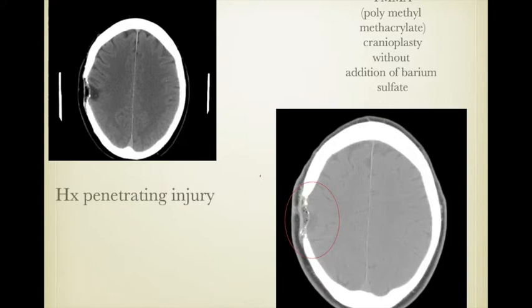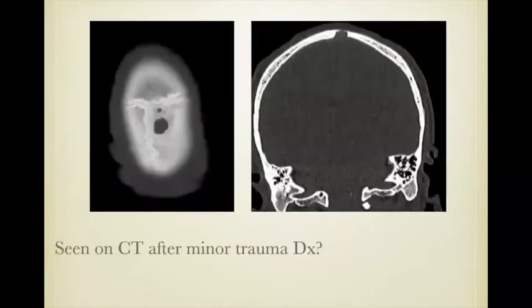And in the formation of the cement, oftentimes small bubbles of air are trapped. And you'll notice in these cases that if you look at them from date to date, even as years go by, the distribution of the air bubbles is the same. So don't be alarmed at not seeing the cranioplasty itself. If this is an older scan, the additives were not used until more recently. And don't be alarmed if you see air bubbles there, particularly if you don't see any air outside of the flap. And of course, look back to older scans and you'll see the same air bubbles on all of them.